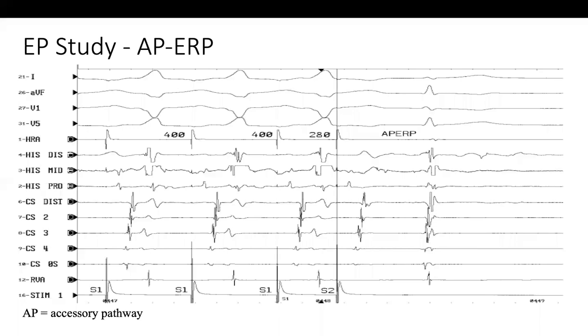I should say negative delta wave, because sometimes you get a negative delta with no clear negativity of the QRS itself. So negative delta rather than negative QRS. You are talking about negative delta in V1, which makes it likely to be a right-sided accessory pathway.